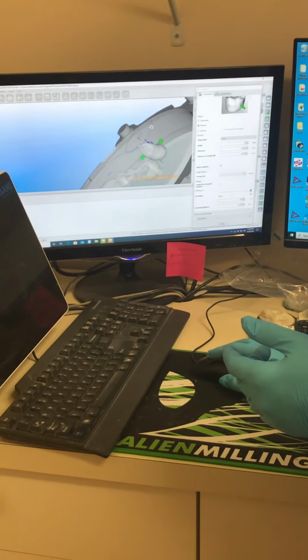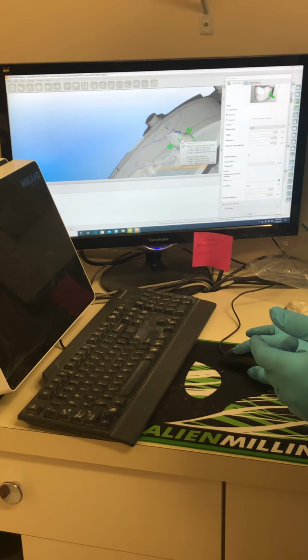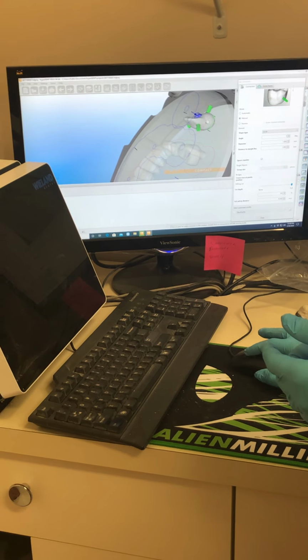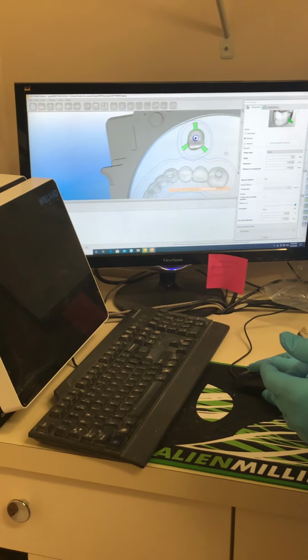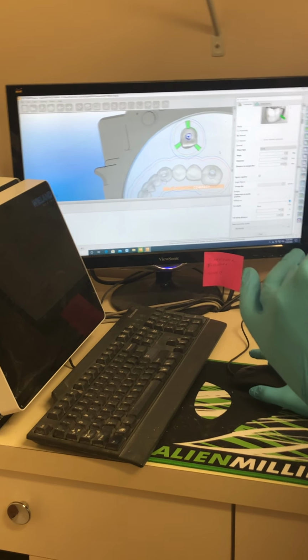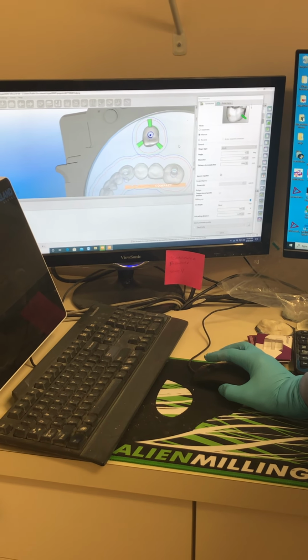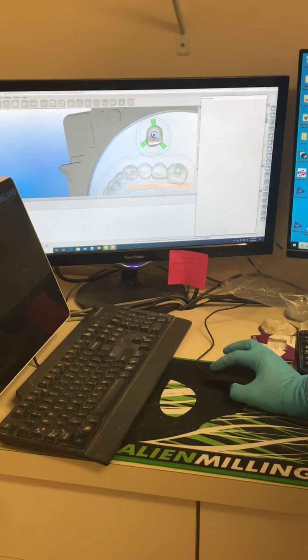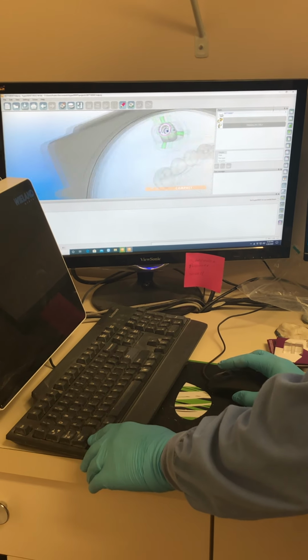I like to use 3 connectors just to be safe. I avoid the interproximal areas because those are the contact areas. You want to avoid that so you don't have to trim it, and after that the crown is too loose or too tight. Okay, close the connector window, change here, go to the margin line.